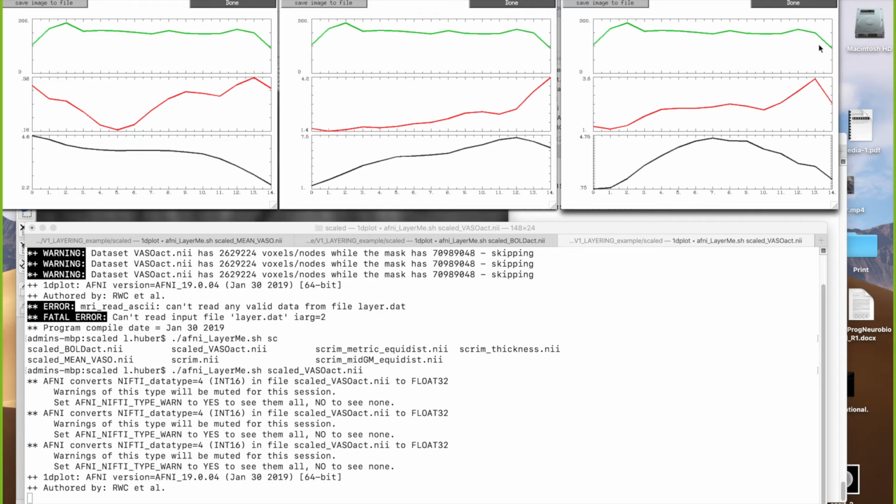Do we have any questions about the upsampling? I'm sorry that I didn't really explicitly warn you that AFNI is very handy to have last session. In fact, I have a script that does the upsampling in LAYNII too, but that's in a very old version of LAYNII using Odin libraries. So maybe that's also something to have in, because it's so simple to include an upsampling in LAYNII.